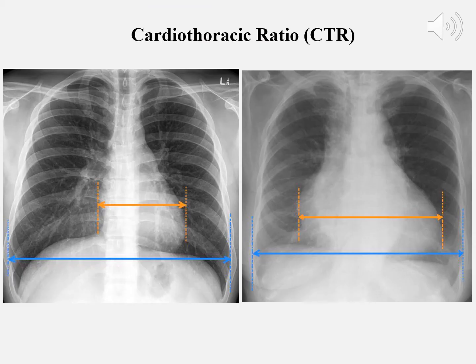Hey guys, listen, don't get caught up, and I hope I didn't confuse you on one of the earlier slides. When I'm talking left from right, I need to clarify that. Sometimes I'm talking about the left side of the screen versus the anatomical left portion of the chest in the image. So, for instance, for cardiothoracic ratio, the left side of the image when you're looking at it contains the right atrium. The right side of the image contains the left ventricle and the other aspect. But look, don't get caught up in all that.